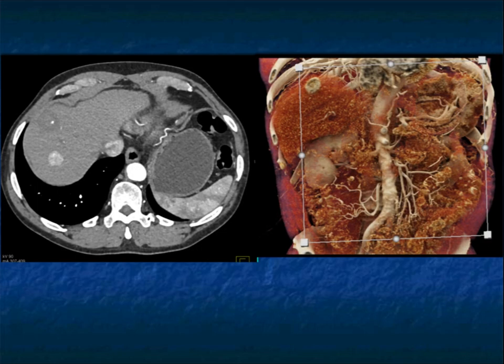Well, it's a solid vascular lesion, and the liver is cirrhotic. So the one thing I have a problem with, I have 3 problems. One is hemangiomas have peripheral enhancement and can fill in and be bright, but usually they're less bright, and I don't see the filling in here. I just see a bright lesion. What about FNH? Well, we said FNH is as bright as the IVC, and that's what this lesion kind of is. But the patient has a cirrhotic liver.